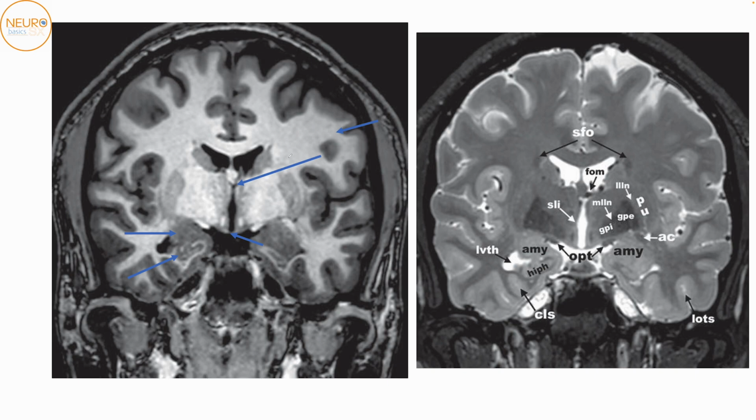Okay, now we can see a clear track between the frontal horns and the third ventricle. So this is the foramen of Monro over here. At the level of the foramen of Monro, the internal capsule will correspond to the genu. Here you would find the genu of the internal capsule. So any cuts posterior to this, we would have the posterior limb of the internal capsule and not the anterior limb.